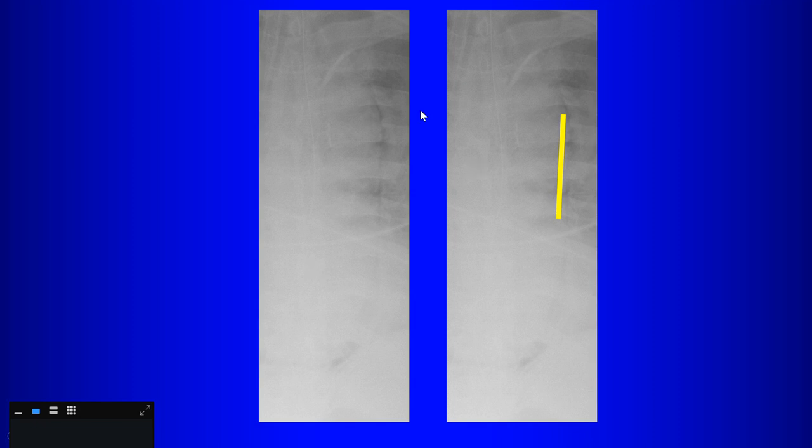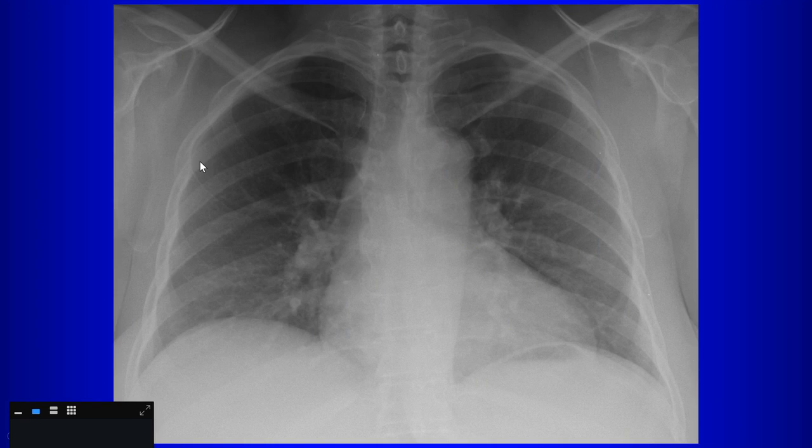If you recognize that at the edge of a structure, especially when there are changes in attenuation or density on an X-ray, you can have these Mach effects, then you can recognize that that's not a pneumomediastinum, that's just a Mach effect.